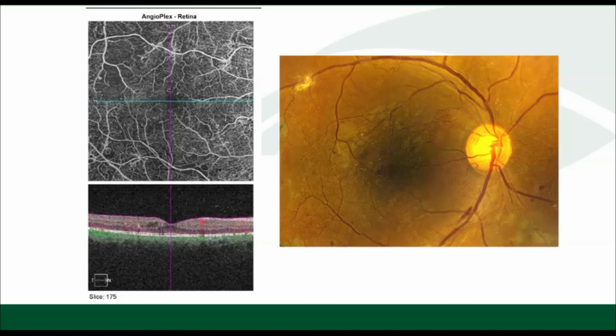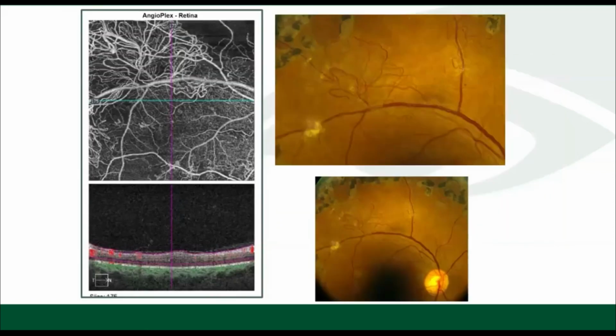You look on the OCT angiography and you can see some changes at a capillary level. You can see some pruning of the vessels to some degree. But where it really is remarkable is when you do the OCT scan along the arcade. And you see very nicely, very beautifully, this neovascular frond.